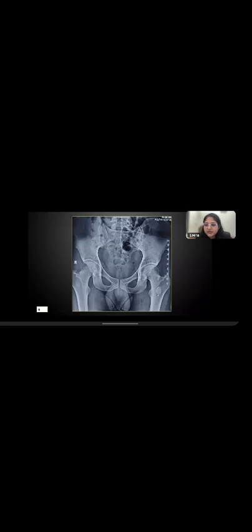6 is bone island. Dr. Harsh has given the correct answer in the first instance itself. So yes, there is a bone island in the left femur in the intertrochanteric region, and that's why it is so evident why it is benign, because there is a well-defined lesion, there is no cortical destruction, no periosteal reaction, and it is a touch me not lesion. You just have to tell the patient that it is there. That's why I'm telling you. You need not do anything about it.